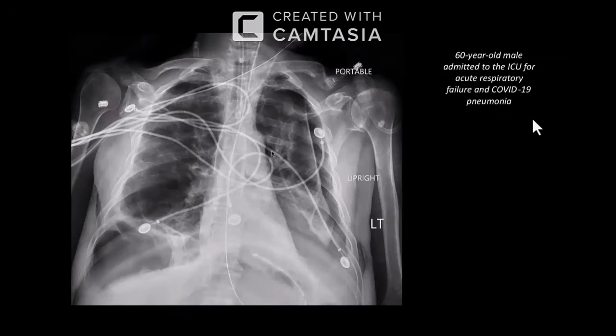And look at the heart shadow. You have not mentioned anything about the heart shadow, though. Slightly tubular kind of picture, isn't it? Yes. Apart from that, you have picked up the pleural effusion, that is blunting of the right costophrenic angle.